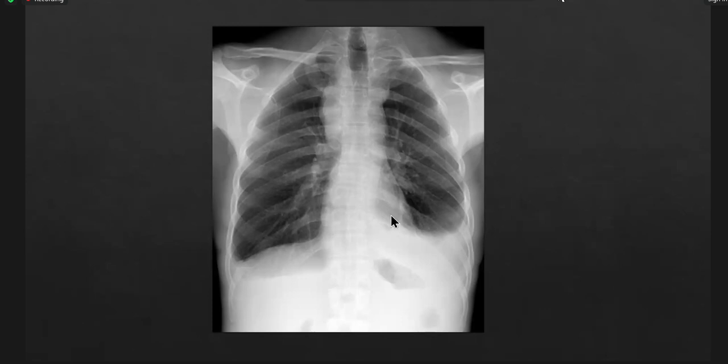Why I want to show you this is, what do you think this is? Just come to the diagnosis. So, left pleural effusion? Very good. How do you define this? Well-defined opacity, left lower lobe with upper margins. So it's a well-defined soft tissue opacity with a concave upper margin. It's obscuring the left CP angle and the left dome of the diaphragm and extending along the costal pleura on the left. Perfect.